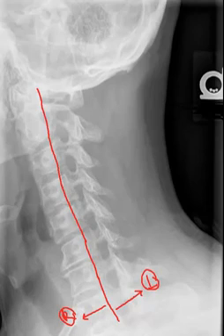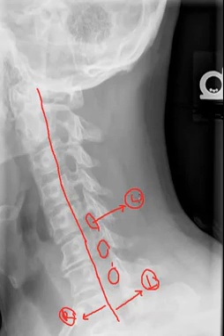For example, here are the intervertebral foramen, these nice lucent holes that you are visualizing along the posterior-most aspect of the spine. Notice that these intervertebral foramen are located on the left side of the patient, as indicated by the radiographic marker here. Therefore, these are left-sided IVFs.